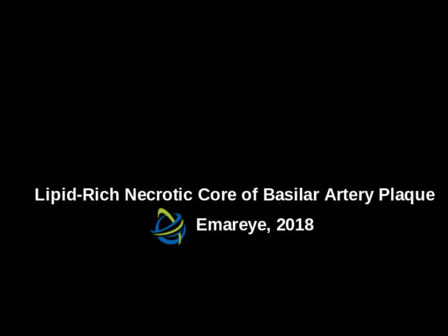This figure 2 is the brain image of a 78-year-old male. After the volume rendering reconstruction using time-of-flight MR angiography, image A shows diffuse narrowing of the basilar artery with a stenosis degree of 67%. In the DWI image B, multiple high signal intensities were observed in both occipital lobes.